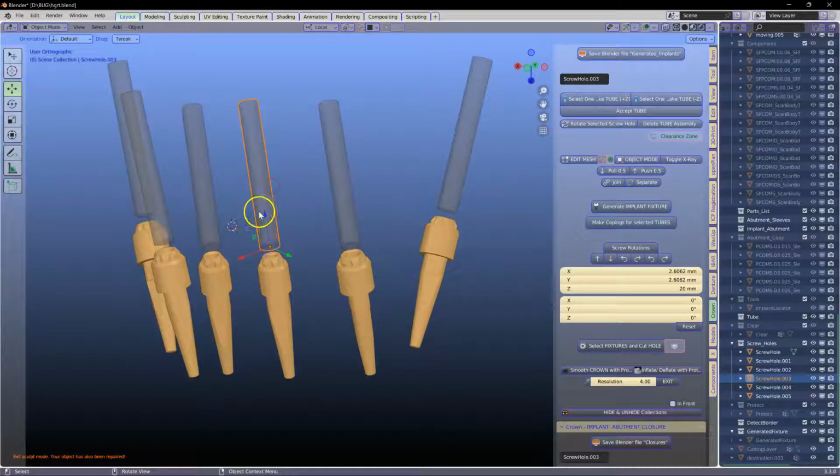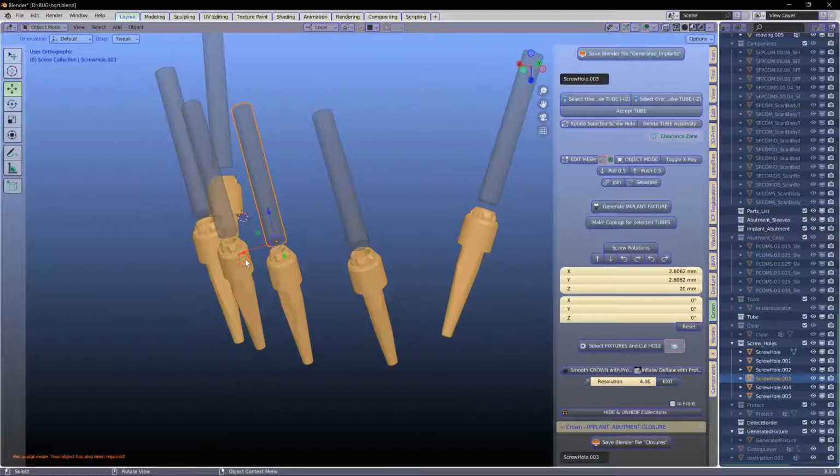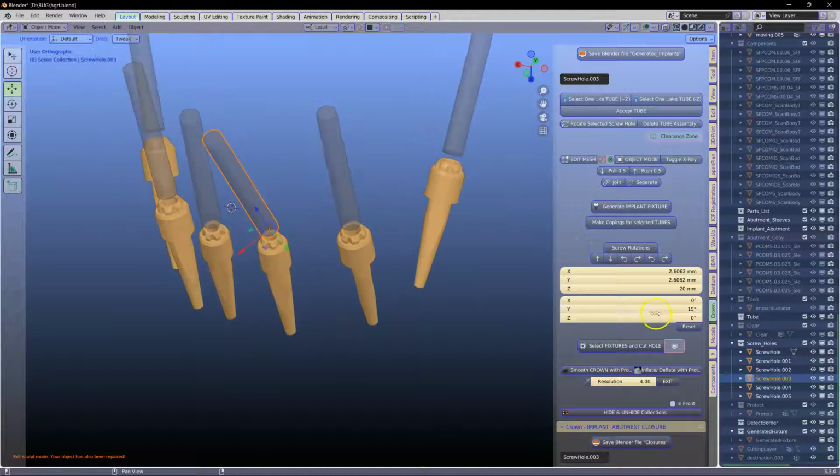So if our scan body has a little anti-rotation wedge in it, we know which the x and y axis is, and all we need to do is go in the, say, y axis 15 degrees or whatever, or in the x axis, and we know that the angle would be correct there.